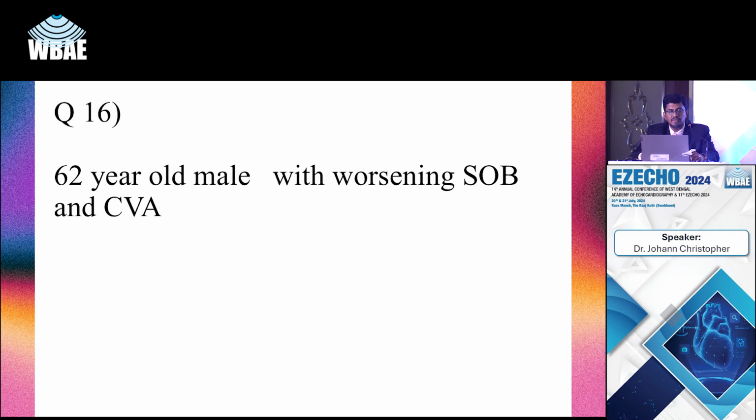We have looked at his valve and we have looked at his aorta, and we have done this without a single ml of contrast, the CKD patient. So we decided not to do CT as we would have done, but we went ahead with a plain MR study, no contrast. The red arrow is pointing to the diagnosis.